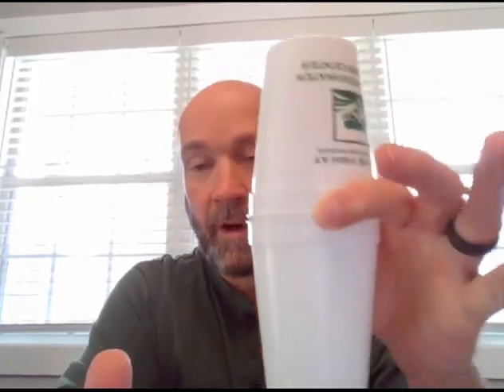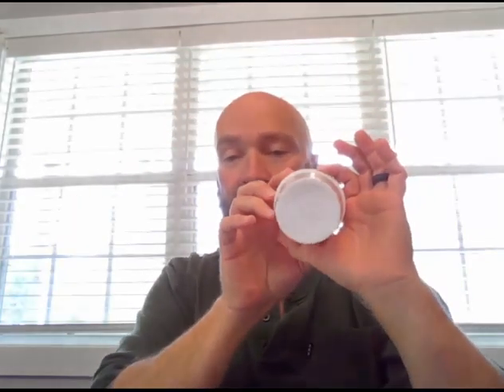So what I want you to hang on to for this is, let's say this is representative of your distal forearm, or your distal humerus, rather. So what you've got here is your two condyles, and when they're perfectly superimposed, again, my camera is backwards, so every time I move that way, it looks like it's moving towards one direction, but to me it's going the opposite direction of what I'm showing. So if they're perfectly superimposed, you see this nice round density, right?